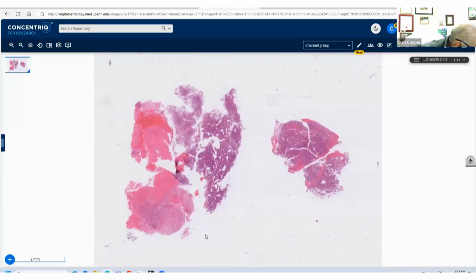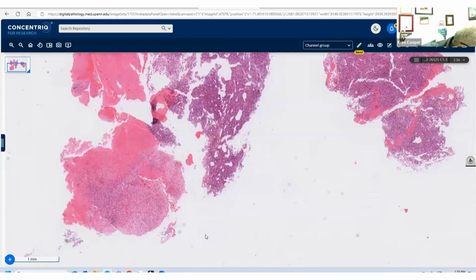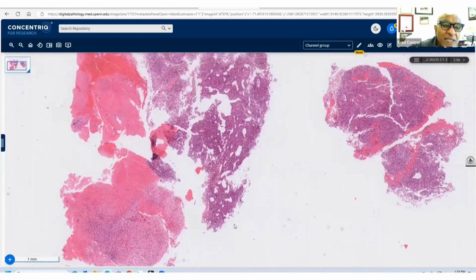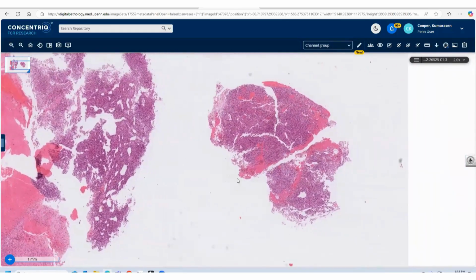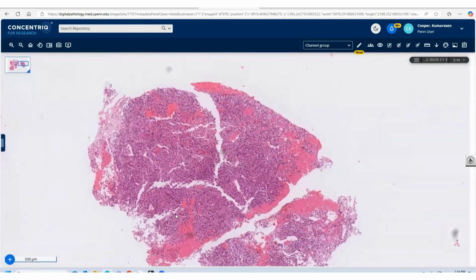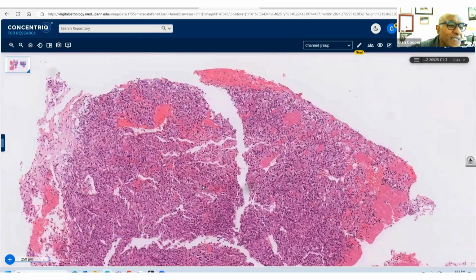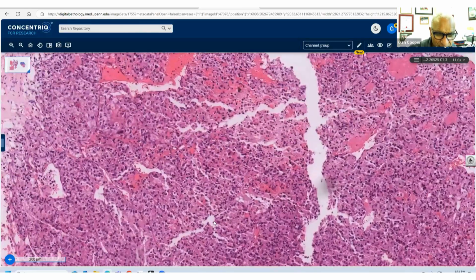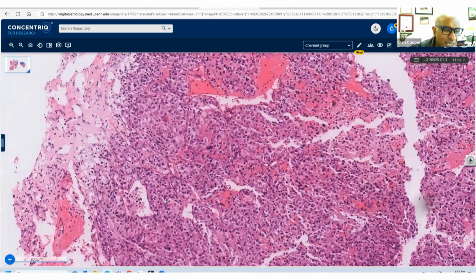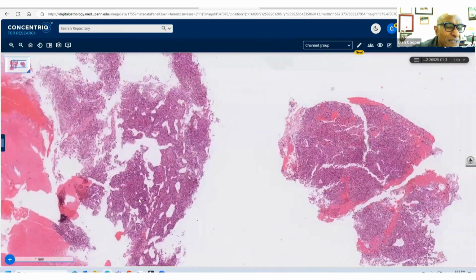Okay, let's try this one. I'm now jumping to head and neck, ENT. This was a tumor in the sphenoid sinus, close to where you live, Maria. My two favorite things: head and neck and possibly pituitary, depending on what this looks like. There you go. Lovely. So, pretty cellular, pink. And here, this is a little squashed. Oh, it's not too bad. There we go.